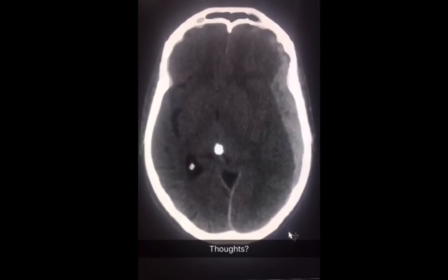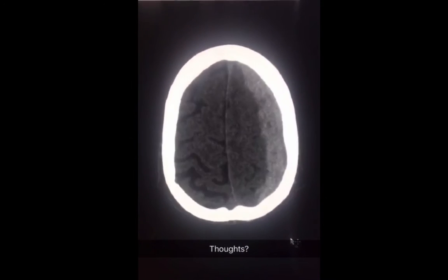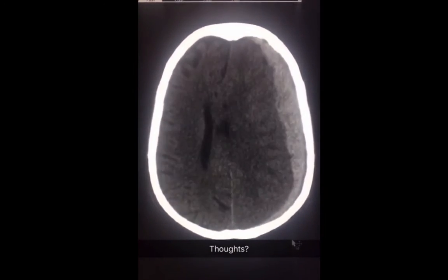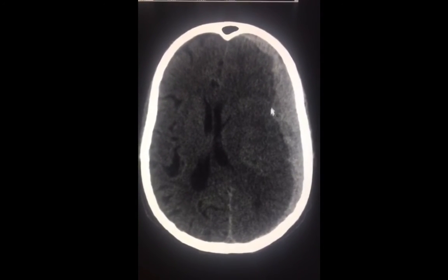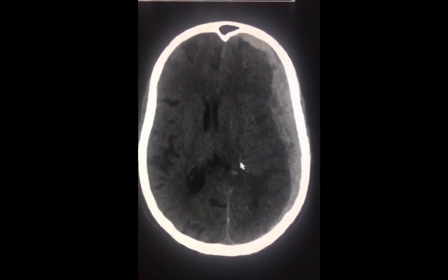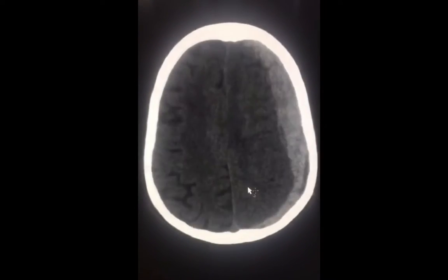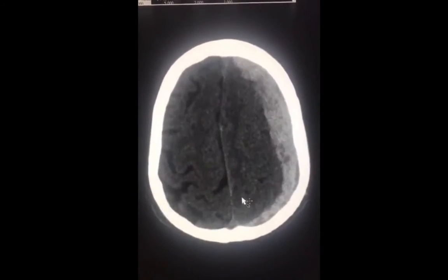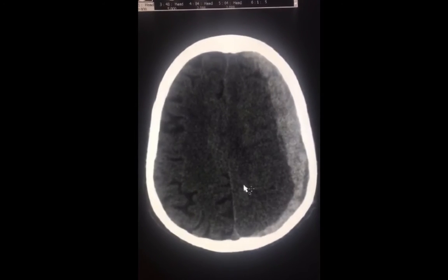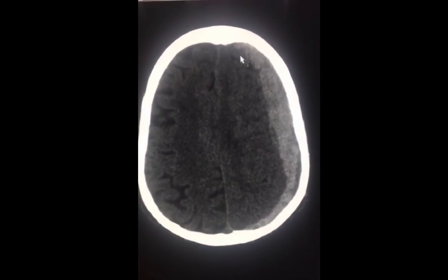This is a 68-year-old male patient who presented with loss of consciousness. This is a study without contrast that shows an extraaxial collection of hyperdensity. This is consistent with bleeding. When confronted with extraaxial bleeds, you need to differentiate between two types, the subdural hematoma and epidural hematoma. This is a case of left-sided subdural hematoma.